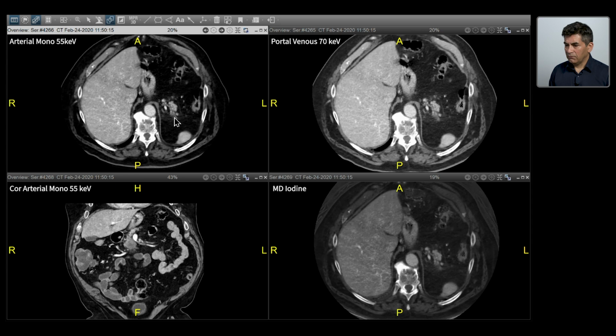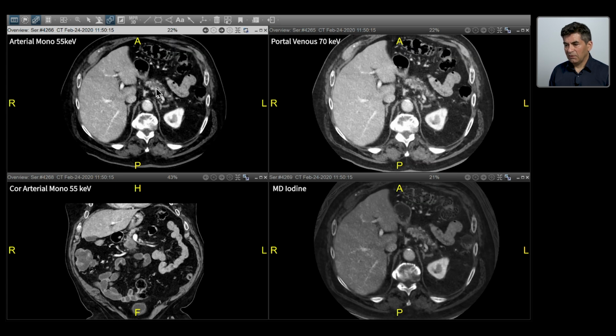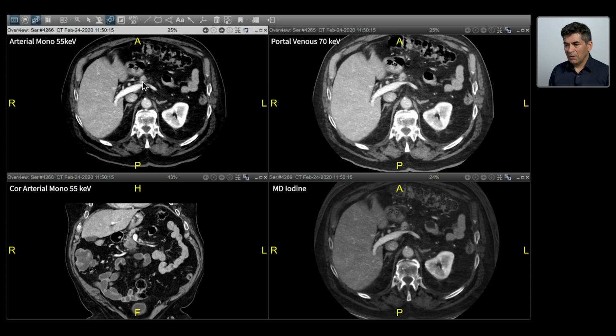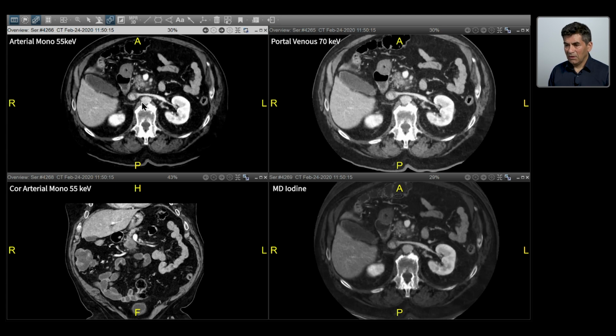We go and look for the pancreas. Here, this is the body of the pancreas. This pancreas is slightly atrophied. There is heterogeneity. We trace the pancreas. We see additional heterogeneity in the pancreas and volume loss. Now I can see the pancreatic duct in the center of my image. I'll follow the pancreatic duct. It leads to even more heterogeneity. Now we are in the region of the neck and head of the pancreas.